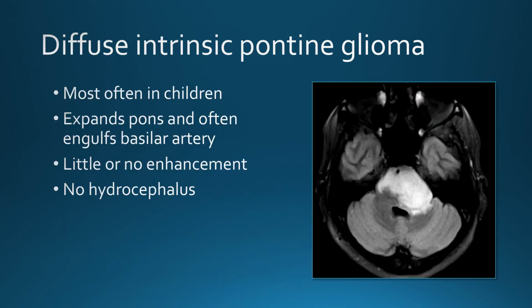So this is most often seen in children. It expands the pons and it often engulfs the basilar artery. Little or no enhancement, and they usually do not have hydrocephalus.